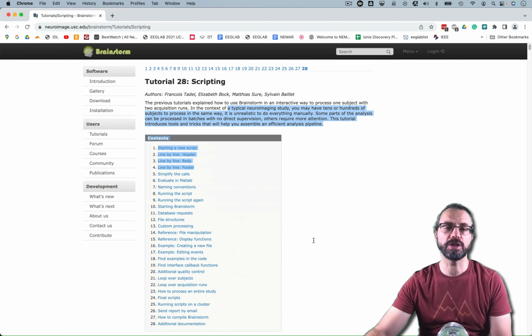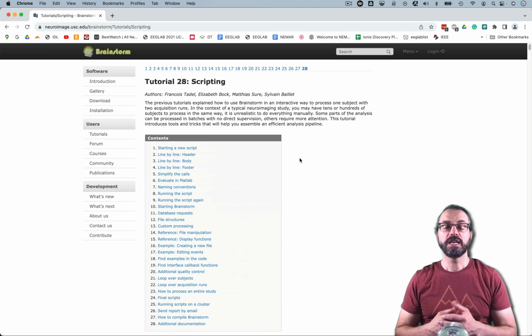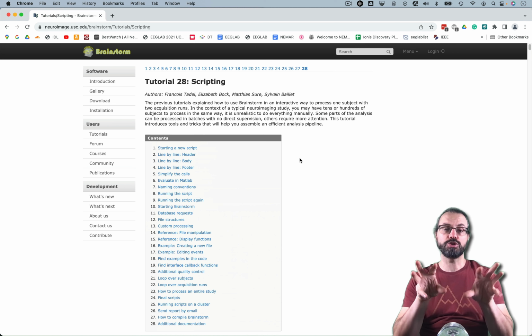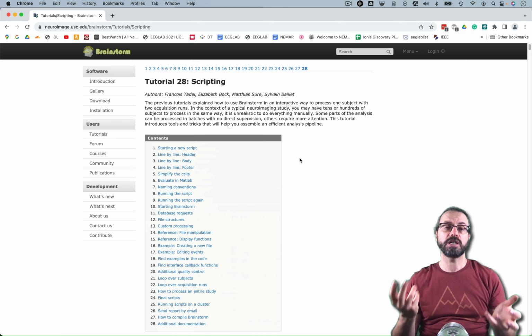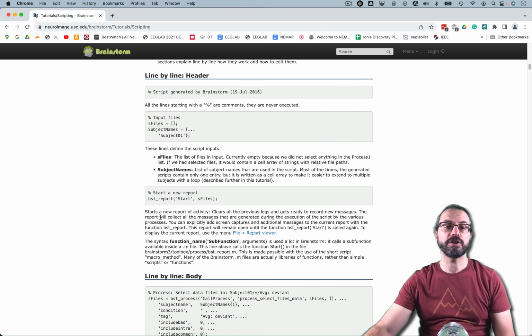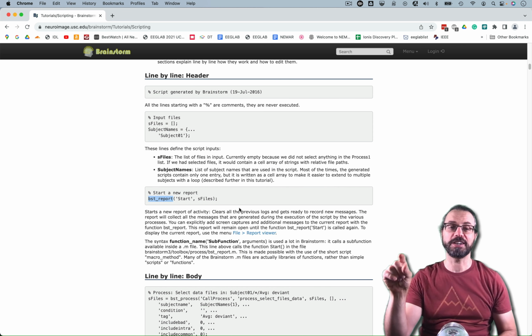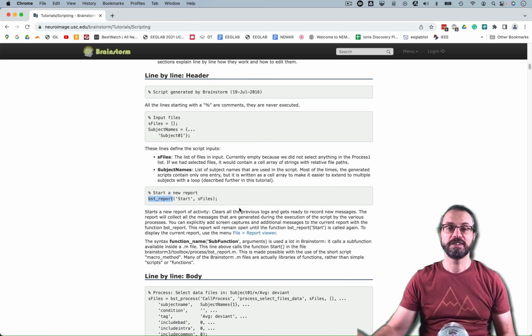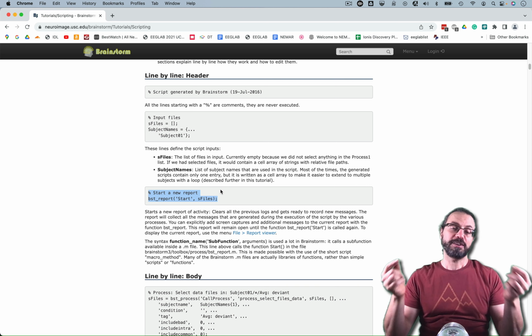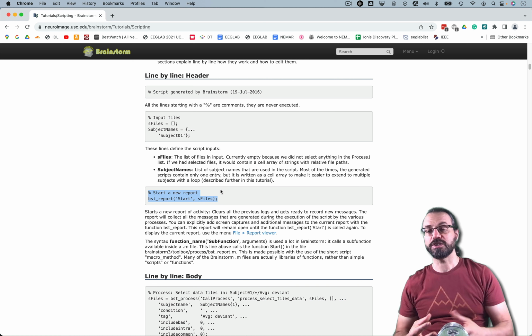The documentation for Brainstorm scripting is relatively poor compared to other languages, and one of the issues I have with Brainstorm, and maybe it's because it's GUI based, is that the functions are not documented. For example, it tells you okay, use this function, bst_report, but if you type help bst_report, there's just one line, build report for Brainstorm, so it doesn't describe the parameters. If you want to know the parameters, you have to look inside the functions and read the code, and maybe you can understand the parameters.